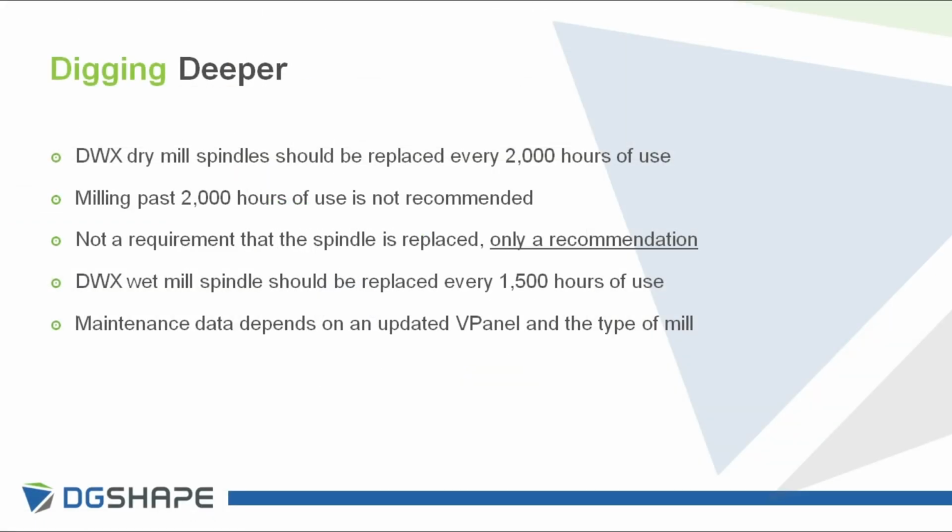Now that we've covered the key benefits DGSHAPE Insights has to offer, let's dig into the last three panels and their features.